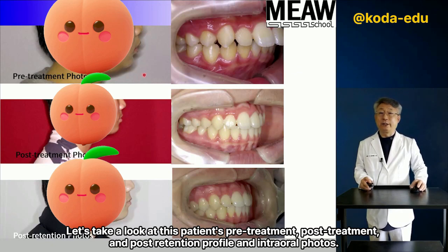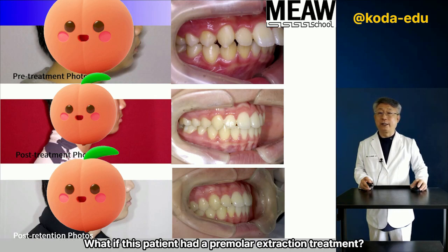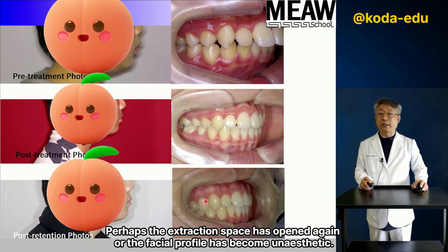Let's take a look at this patient's pre-treatment, post-treatment, and post-retention profile and intraoral photos. Even after treatment with non-extraction, it turned into a good profile. What if this patient had a premolar extraction treatment? Perhaps the extraction space would have opened again or the facial profile would have become unaesthetic.